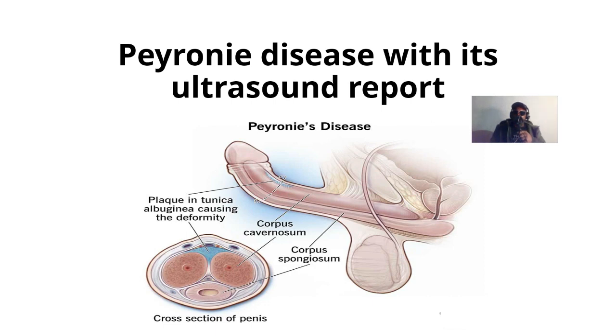In this video, I am going to talk about Peyronie's disease, and I'm going to give you a simple ultrasound report of Peyronie's disease.